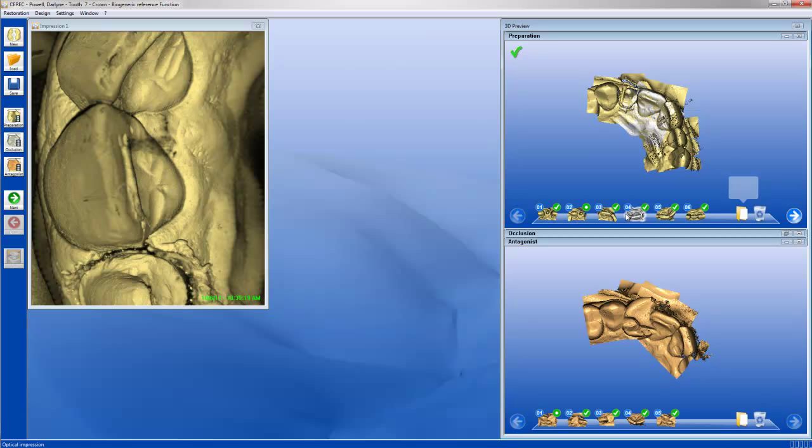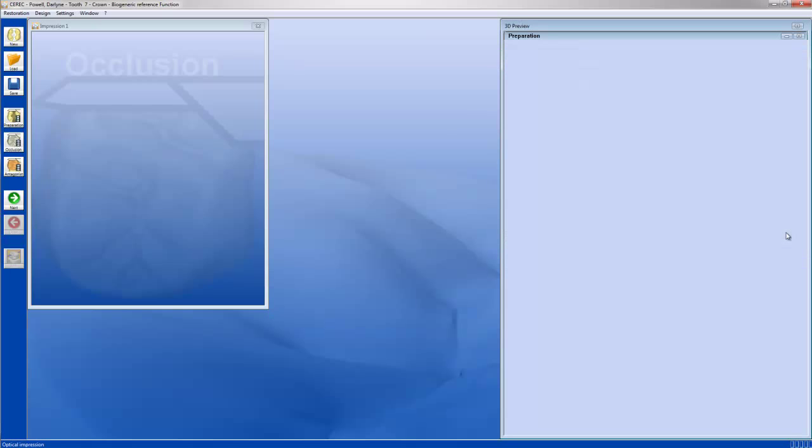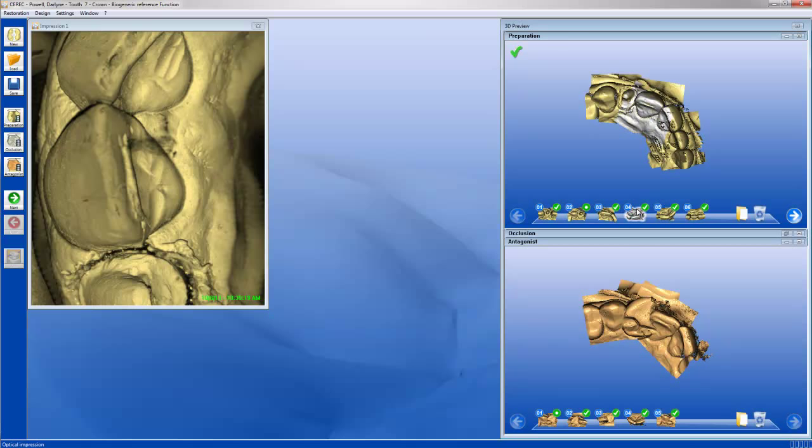Now there is no need in this software to flip the camera at the midline. You can simply go ahead and just keep the camera in the same plane and not have to image. And what I probably would have done is image 6, 7, and 8 here, and instead of trying to make one big model, I would have imaged tooth number 10 over here, because then what we could do is use tooth number 10 as the reference instead of having this big model over here. Probably would have just made imaging a bit easier. We could have gotten rid of some of the distortions there.